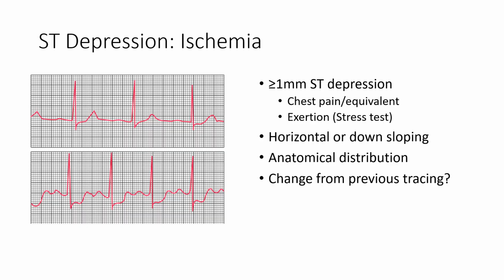And then also this should be a change from previous tracings. If a patient has an underlying condition that causes their ST segments to be depressed and they've been there for the last 10 years, then we cannot say that those ST segment depressions correlate with their current symptoms.